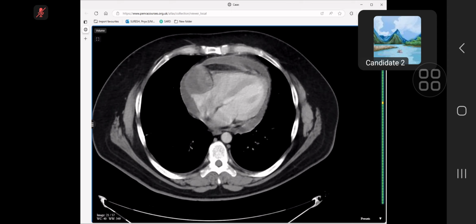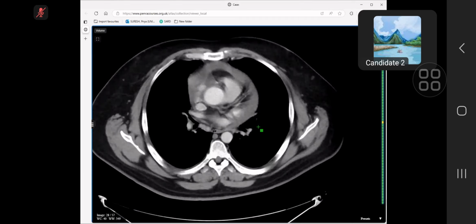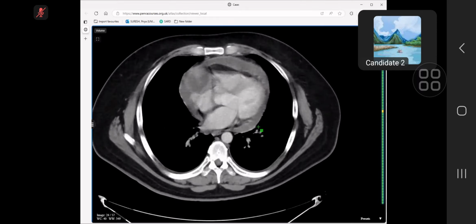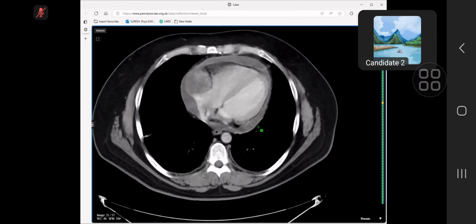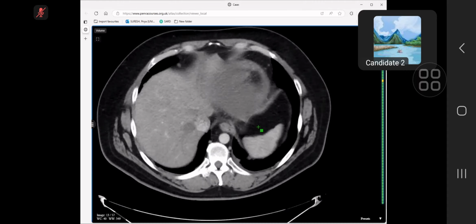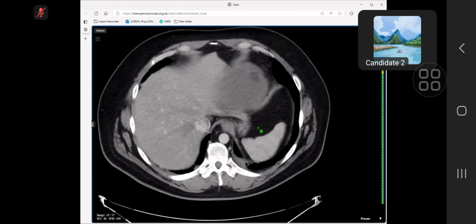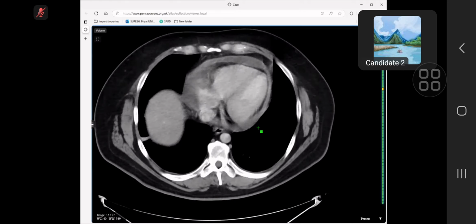In the plain chest radiograph, I was suspecting a bottle-shaped heart, might be due to pericardial effusion, but this looks more like a soft tissue density mass lesion encircling the heart. I would first like to see the whole of the images. It is involving one of the chambers. There is reflux of contrast within the IVC and not in the hepatic veins.